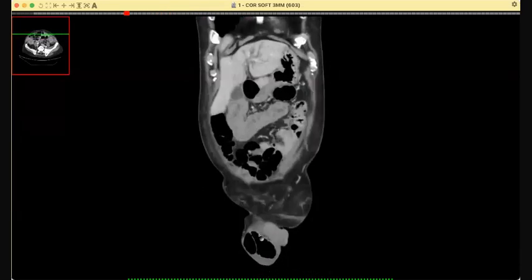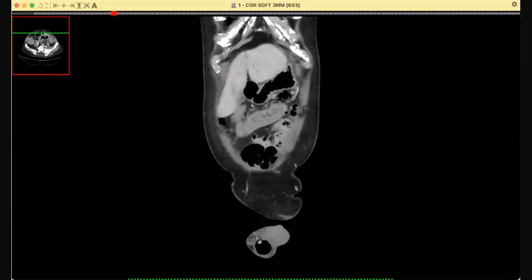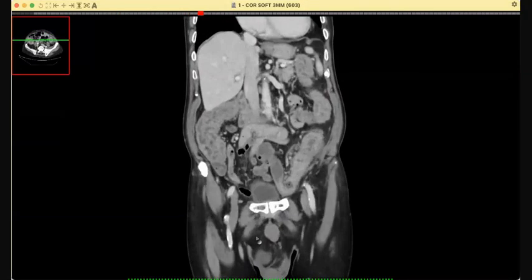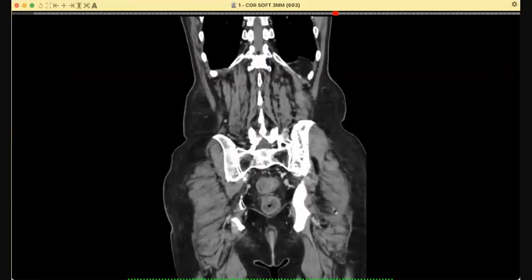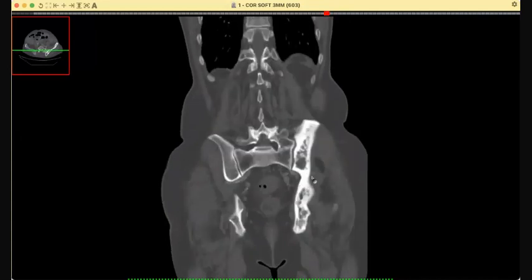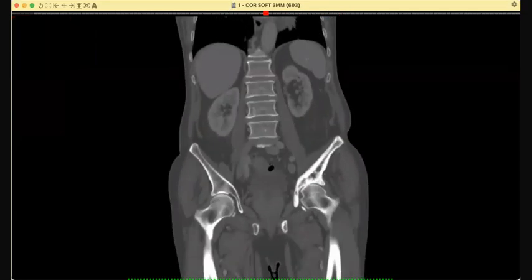Similarly, the right hernia was also not causing obstruction, but the idea was to pick them up, particularly on the plain film. And pertinent negatives was that there was no sacroiliitis, but look at the Paget's disease. It's classical Paget's disease. So case of multiple findings. Well done, candidate.